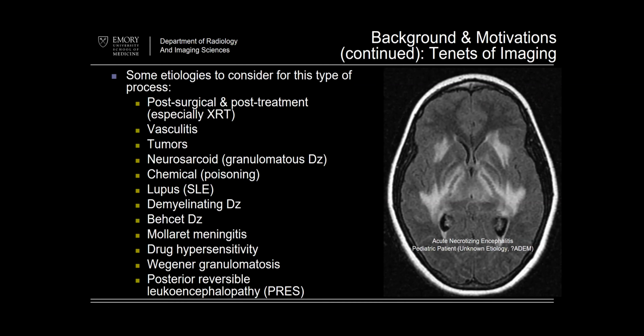I'm a splitter, so to me, brain swelling is swelling of the brain, straightforward. To me, cerebral edema is increased water within the brain and can, on a CT scan, decrease density, and on an MRI, increase T2/FLAIR. Here's somebody with a relatively symmetric process, clearly a white matter process, even though it's secondarily involving deep gray structures, and there's prominent involvement of the brainstem.